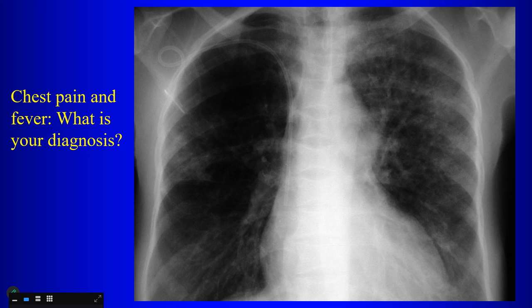Kevin, you're doing MSK. I was going to say there's the central venous catheter. Well, yeah, right. Let's see the vertebra. What about the vertebra? H-shaped. Yeah, so these vertebrae are H-shaped, right? See that? It can be subtle on the frontal view. So what does that tell you? Yeah, so the patient has sickle cell disease.